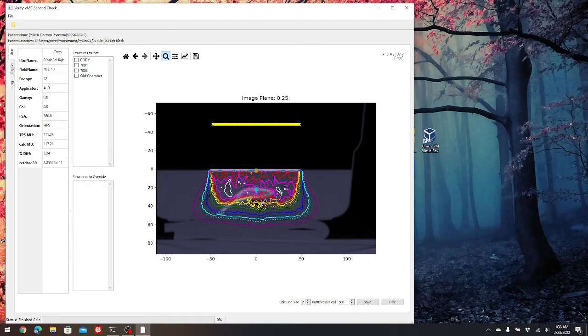In this case, my treatment planning system is Eclipse. So the view automatically zooms to where the ISO center is, which is represented by this orange line, and the reference point, which is represented by this blue diamond. There's a visualization of the cone here in these yellow X marks. And if you have a very complicated block, in this case I just have 4 points for the block, so you don't see it on here. But if you had a more complicated block, you would see red lines indicating where the distance of the block is.